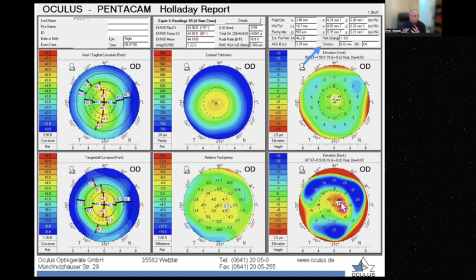of course, there were no rules. The topography was very silly. It was just Placido with some colors here and there. There were no elevation maps, not even a corneal thickness map. We used to do it by ultrasound. And then the patient comes up with disasters. We don't know why, although the anterior curvature map is very beautiful. After the operation, we come with irregular cornea. And this is very specifically in hyperopic treatments.